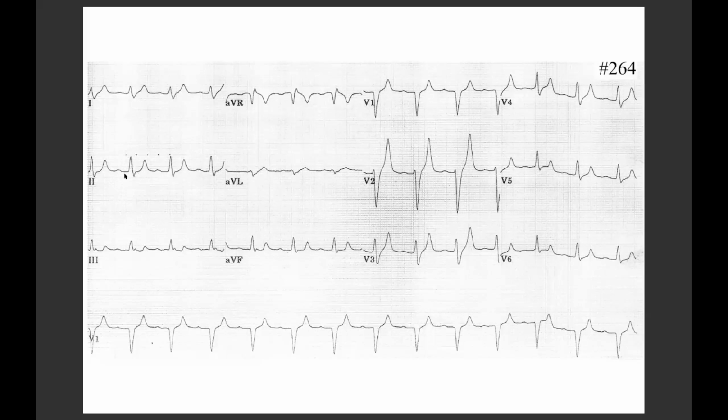Correct. Okay, very good. Then looking into the QRS complex, in lead two, I can say this is within a normal time range. Yes, a little bit looks like it's wide, but it's still in a normal range. Very good. But if you take a look at V1 and V2, is it wider than normal?